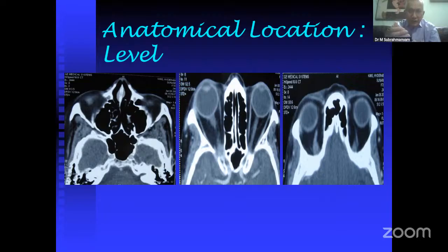Then look in front and behind. If you look in front, and there is a prominence of the nasal part, and behind you see the oropharynx filled with air, this is an inferior cut. On the other hand, if the root of the nose in front is flat, and behind you see the brain tissue, it is the upper cut or superior level cut.